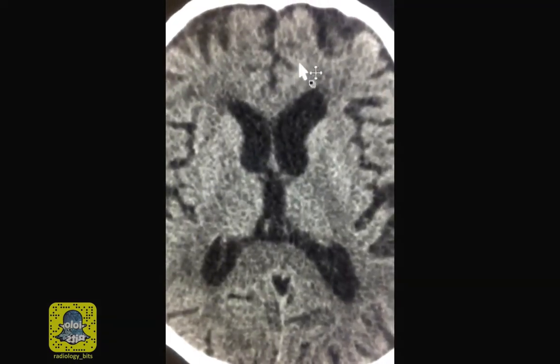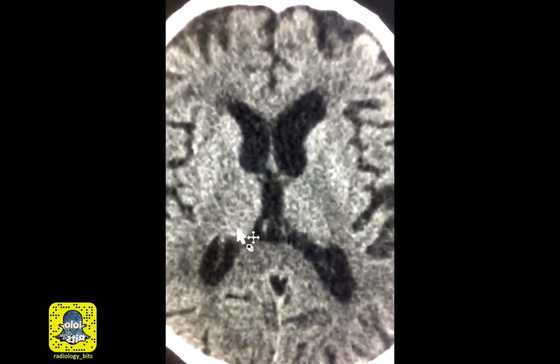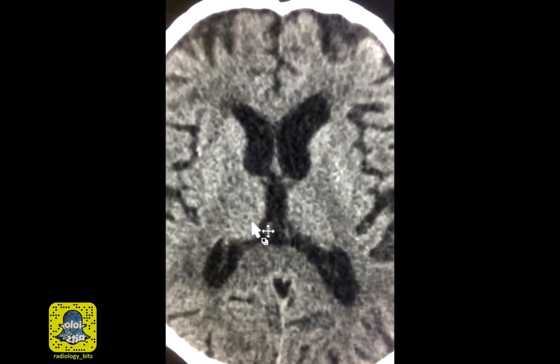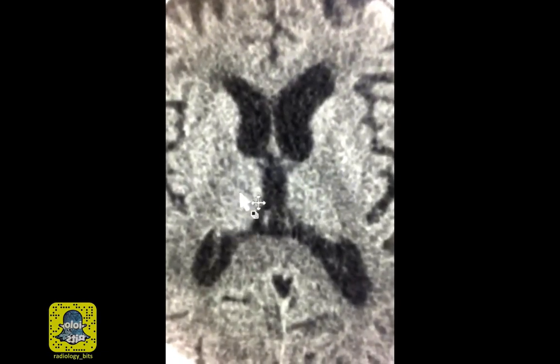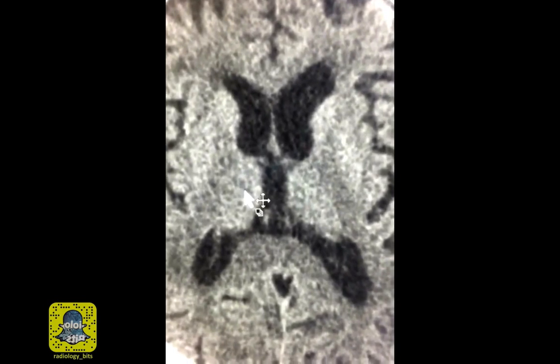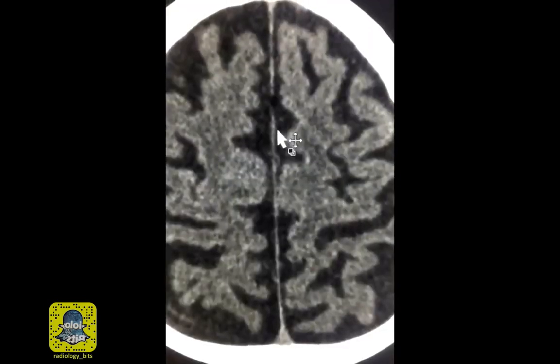Although you have gray matter on the surface of the brain, which we call cortex, you still have gray matter within the brain, which we call the deep gray matter structures. I'll discuss these structures in detail in another clip. For today, we're going to skip that.